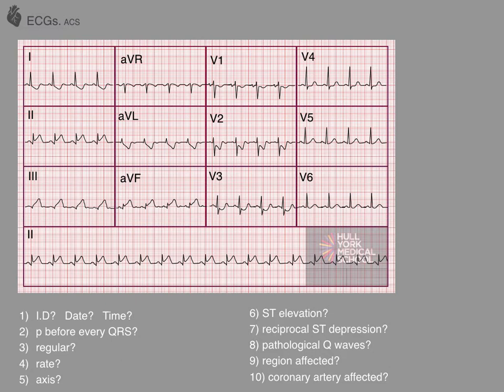So now let's look at some ECG examples. If you want to pause the video at this point, you can go through this yourself and try and work out what's going on. It's a really great idea to get into the practice of going through an ECG systematically. So I've put 10 questions at the bottom here, which you can work through to try and identify the answers for this particular ECG.